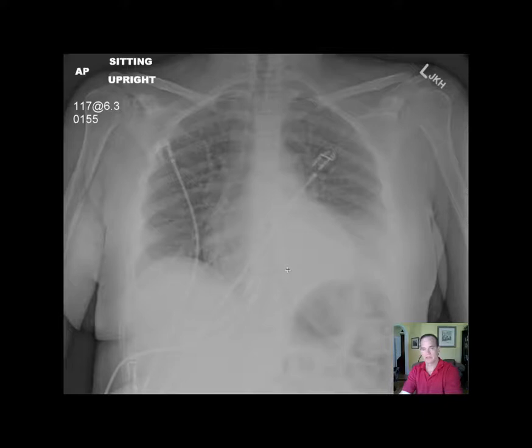Mediastinal silhouette appears unremarkable for technique, meaning that it could look big if it weren't for the fact that it's an AP, not a PA chest. If there were a better degree of inspiration, you'd expect the cardiac silhouette to be smaller, so the limited inspiration and the AP positioning together tend to make the cardiac silhouette in a normal size heart exceed 1/2 the transverse diameter of the chest.